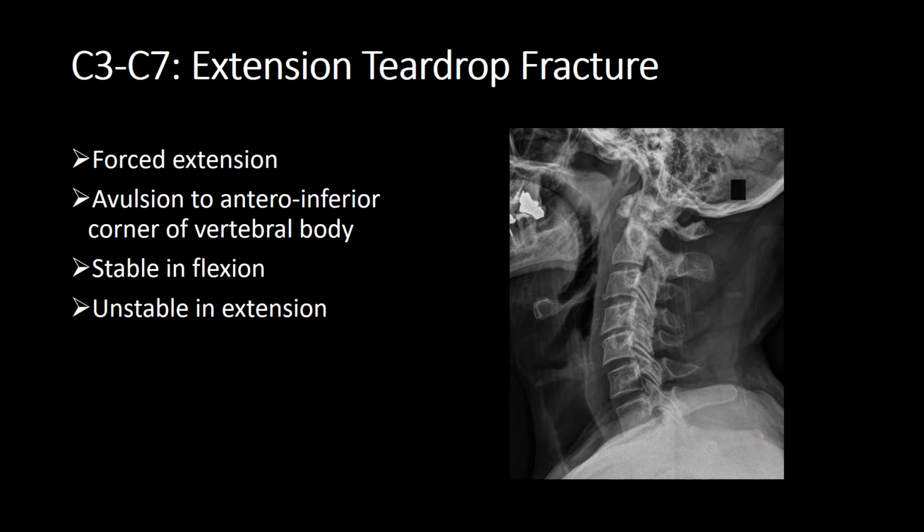Okay, great. So now we've done A is for adequate, S is for soft tissue, A is for alignment, B is for bones, C is for cartilage. Okay, let's look at these intervertebral disc spaces. They're looking okay. A little bit of narrowing here, but there are some early spondylotic changes. So this is most likely due to spondylotic changes caused by disc degeneration, not trauma. Normal, normal.